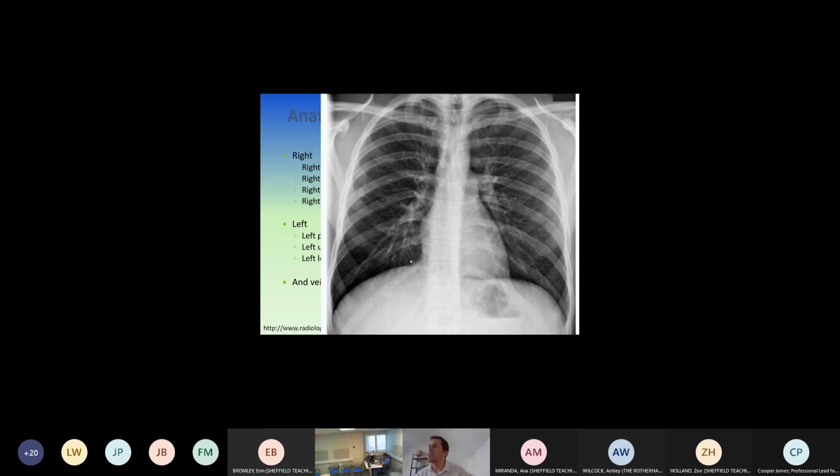So there are 4 hidden areas on chest X-rays. There's the apices, which we've already mentioned. Three quarters of lung cancers occur in the upper lobes, and a lot of those are in the upper zones up here. It's made more complicated by the fact that you've got lots of overlying ribs up here, more so than down here. These are called lawyers' zones because that's the area where we miss these lung cancers. It's where the lawyers like to jump on people who have missed them.